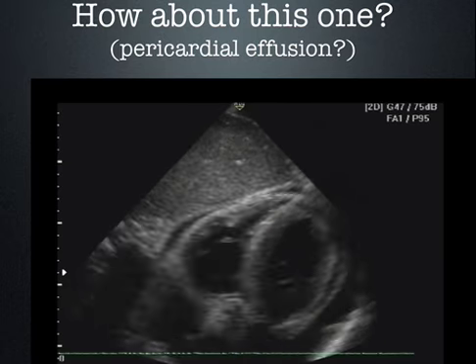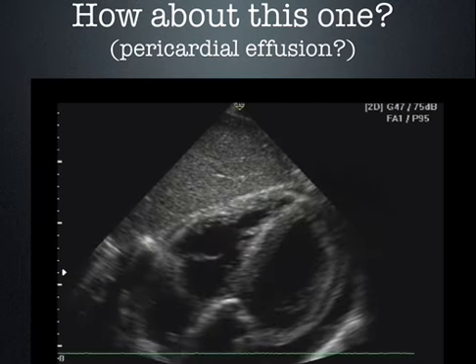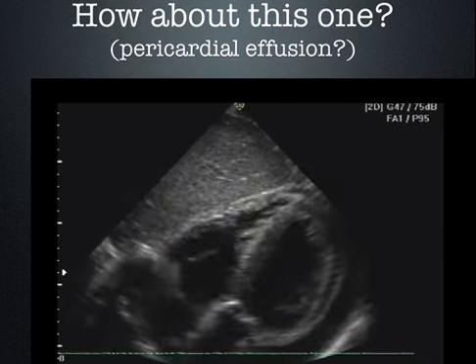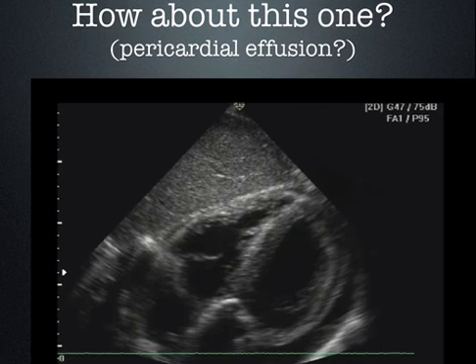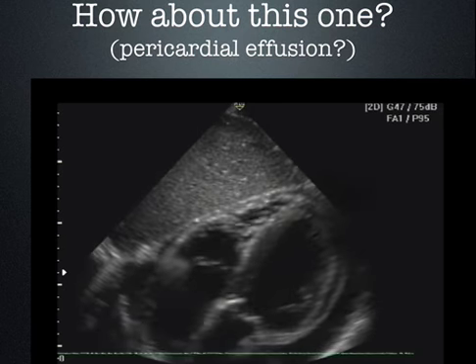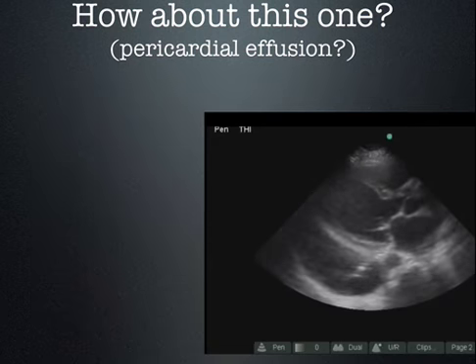With the subcostal window, I caution you just a little bit, left-sided pleural effusions can look like a pericardial effusion. All right, I've seen patients go for emergent thoracotomy in the trauma setting when they just had a hemothorax. So you've got to be a little bit careful with that subcostal window.